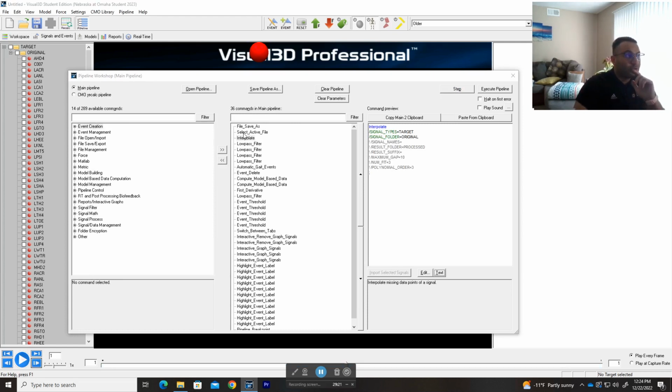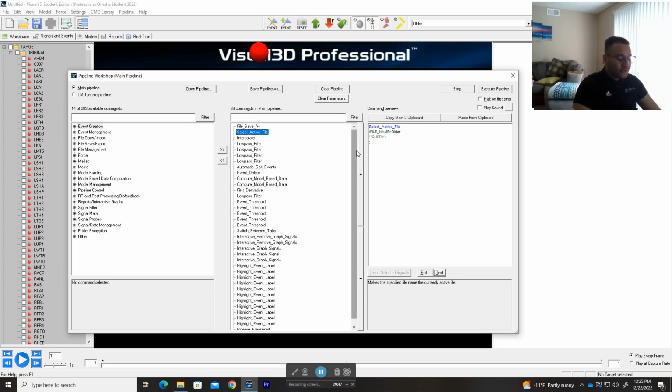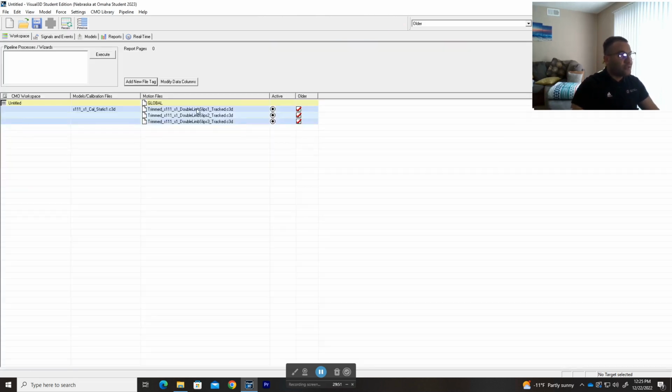Another very useful tool here is if you have names like what I've named those trials, from the time that we started collecting the data in the lab. When you process it, it gives a long name, specifically talking about Mac, though even on Mac you can write anything you want. But the name is very long. So, for example, here in the workspace we have all these names.